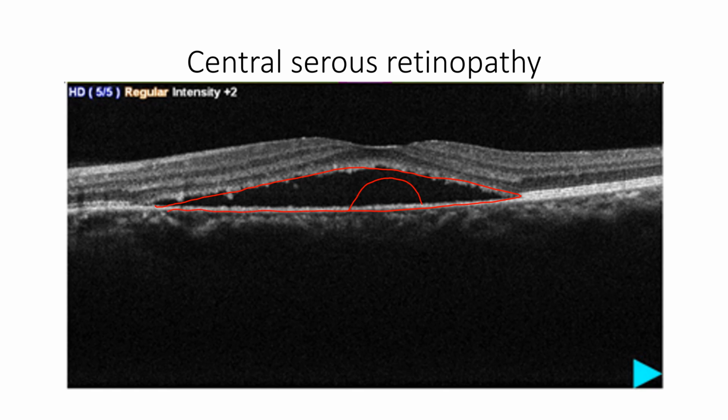So this is one characteristic difference between central serous retinopathy and pigment epithelial detachment, although these two conditions can coexist in one patient. Commonly seen is a pigment epithelial detachment, which is much smaller in size and lies within this area of serous detachment of central serous retinopathy.